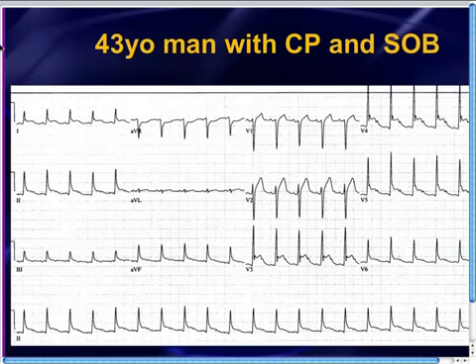And we are oftentimes trying to debate, well, we'll go through the differential of the various causes of ST segment elevation. Of course, STEMI is the one that we worry about the most, we lose sleep over as well. Let's first of all talk about the rhythm before we get into ST segment elevation. And this is a little bit of an extension of what we talked about last week.